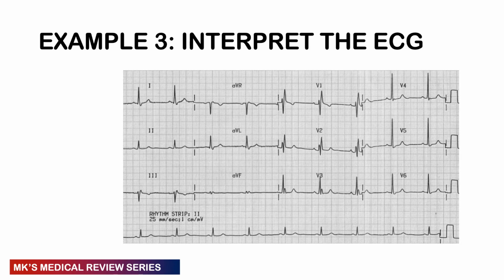Coming to the last ECG, pause the video, interpret the ECG. Now you should be coming close to being a master at picking up these pathologies. Once you watch the remaining videos, which I think I should remain with talking about left bundle branch block, then we need to talk about the hypertrophies, which are 2 more videos, and then we'll talk about ischemia, which is 2 more videos. So you should be left with about 5 more videos to watch, and then you should be done with interpretation of ECG.